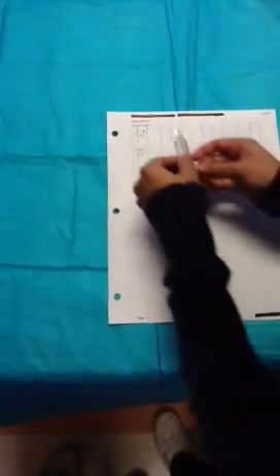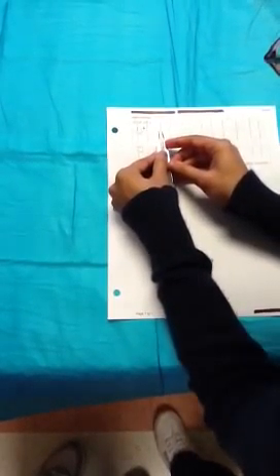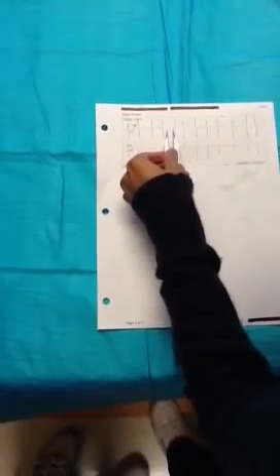If there's something wrong with the ventricles, the QRS would have to be greater than 0.12, and in this case, it's less than 0.12, so there's nothing wrong with the ventricles. So now, since we determined there's something wrong with the P waves, we have to figure out if it's an A flutter or if it's an A fib.